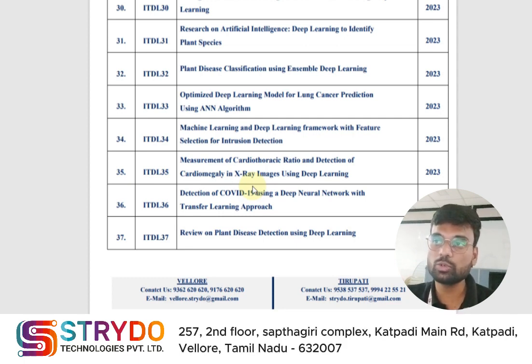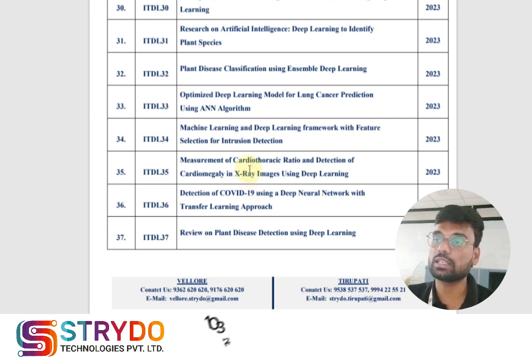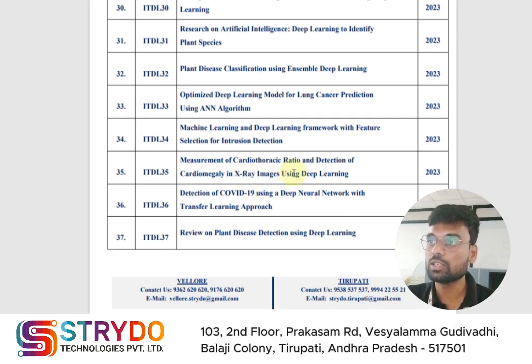In the input layer we give the input in the form of numeric data. In the hidden layers we process the input data, like image features, for example in which direction something is, and detect it that way. After processing through all the layers, it gives the output to the output layer. So let's see the project.